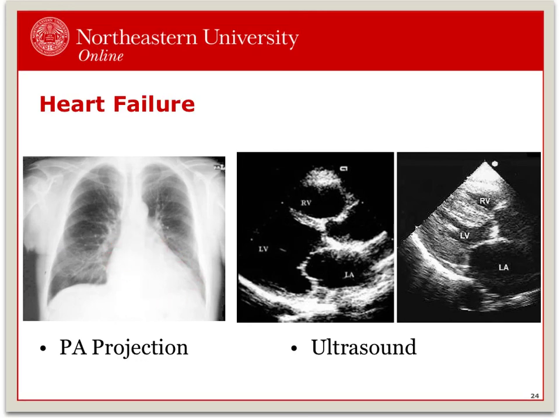Image 2 is an echocardiogram of a normal heart. Notice how the left ventricle is clear and full of blood. And image 3 is an echocardiogram with a thickened left ventricular wall and decreased blood. This is a sign of heart failure. The ejection fraction is an important indicator for the severity of the disease and guides your treatment.